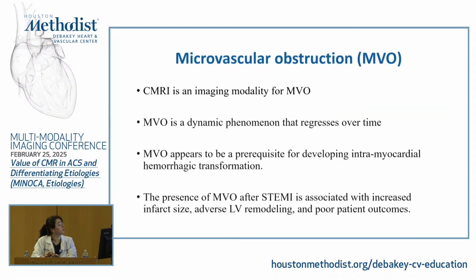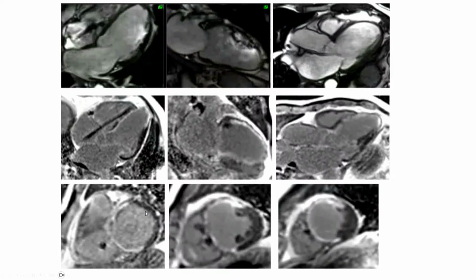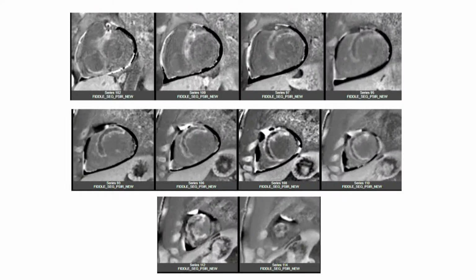So Leila, for one second, if you could go back to the dark blood LGE images for a second, one more back, and one more to this particular patient. So it just takes time. Okay. Right. You want this one or next? You can go forward. Yeah, right there to the dark blood.